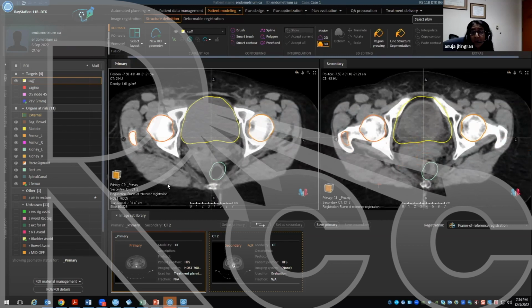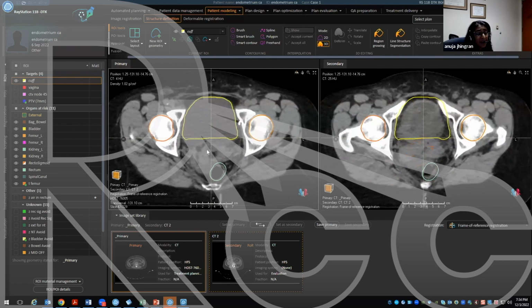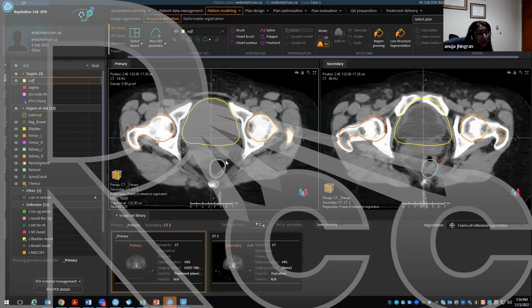And that's where, in this case, a vaginal marker would actually be very beneficial because it may show you the top of the vagina without having to go scrolling in and out. Okay, but I had to scroll in and out. See, this is all bowel right here. So I know that this is probably bowel right here. So the question is, where does the vagina start?